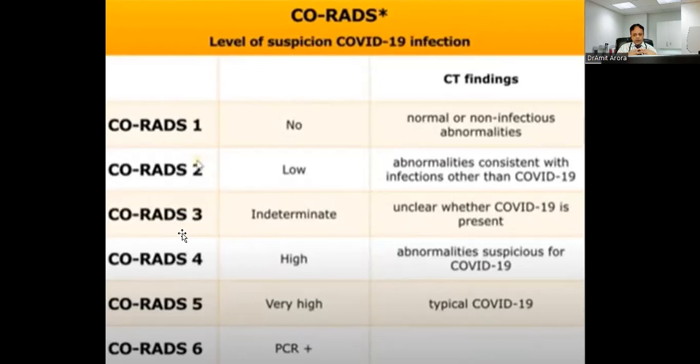Please don't apply this knowledge mistakenly. This should be reserved for the pandemic. Nowadays COVID is not prevalent, so you can make mistakes. CO-RADS 3 means there are some signs of COVID pneumonia, but due to early presentation the signs are not visible properly or well appreciated.